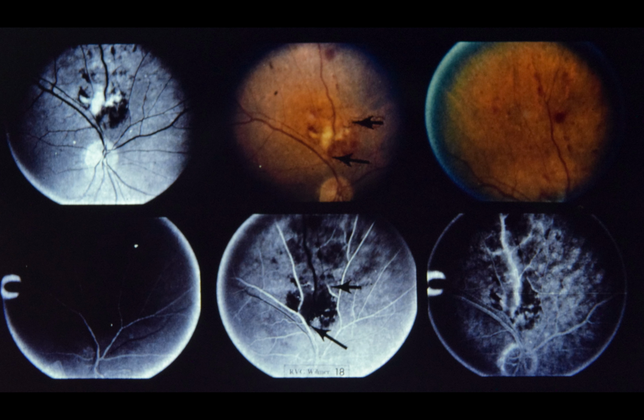In lower left photograph taken 14 seconds after dye injection, arrow points to arterial obstruction. Lower center, small arrow points to arterial obstruction and large arrow points to venous obstruction. Note marked retinal non-perfusion throughout distribution of obstructed vessels. Lower right, retinal non-perfusion persists 10 minutes after injection. Staining of vessel walls is caused by hypoxic damage to vascular endothelium. Also, note early dye leakage into retina.